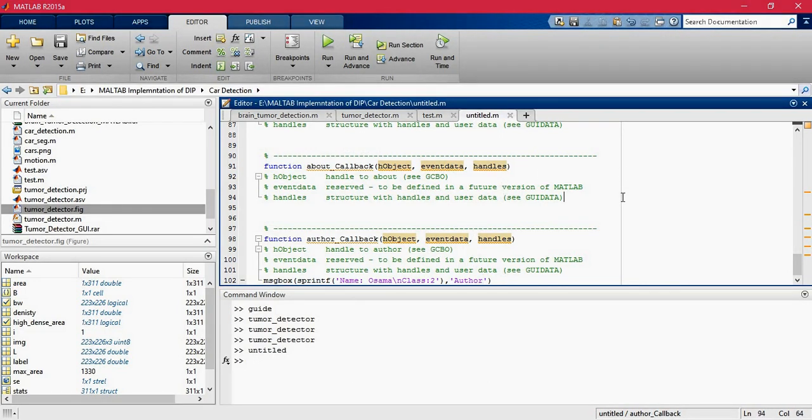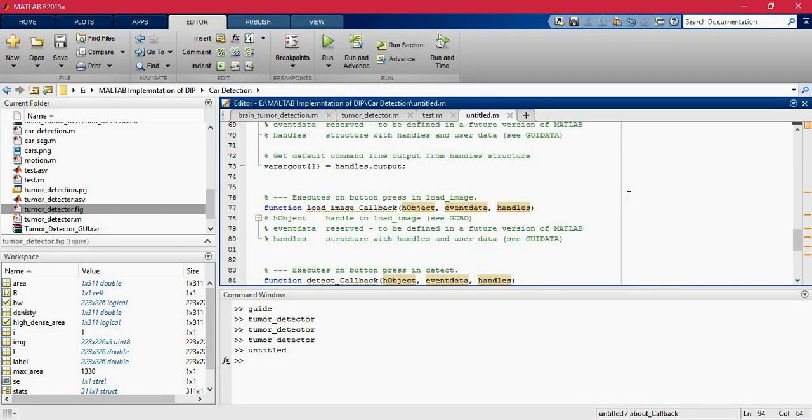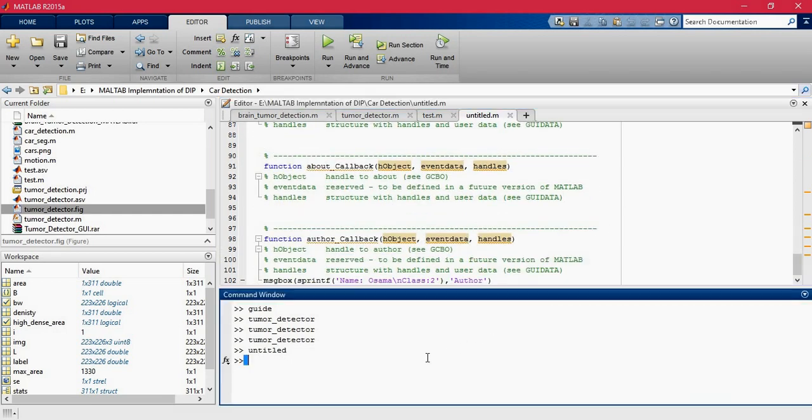it's the end of all what I did. Yes, I forgot to say that you can make it as a standalone application, but you should do something like the mbuild setup command.